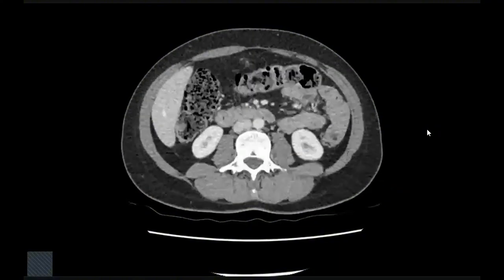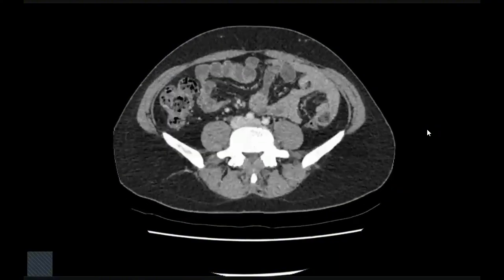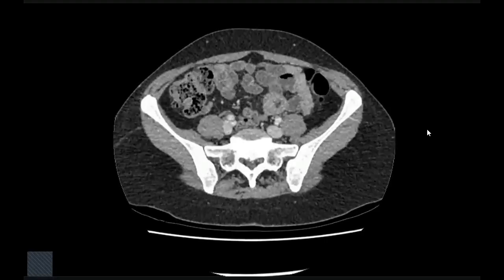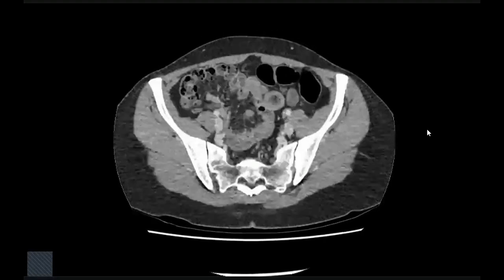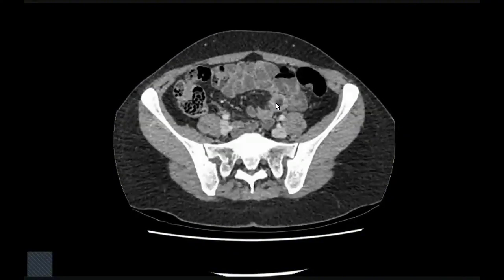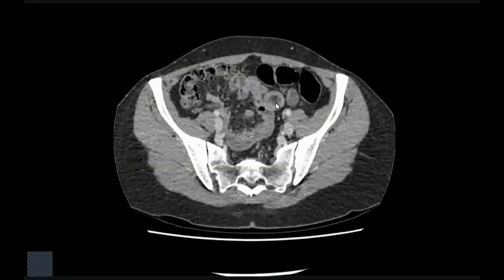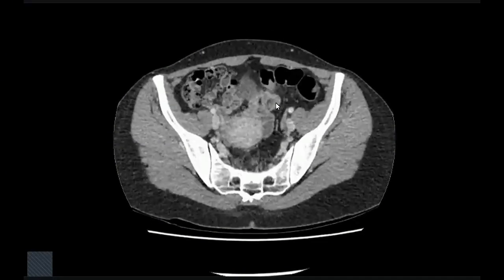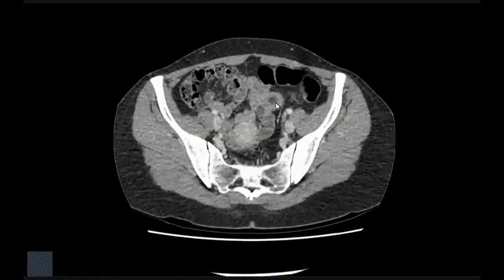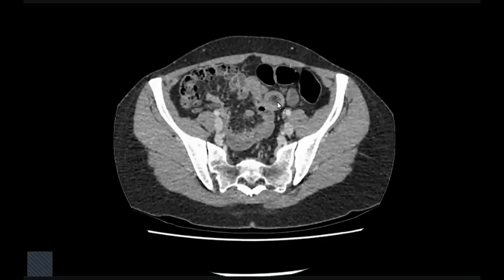Concentrate on the bowel. What causes of acute abdominal pain? In this bowel loop, it appears as if it contained fat density. Can you describe it to me? I'm suspecting it may be like a target sign.